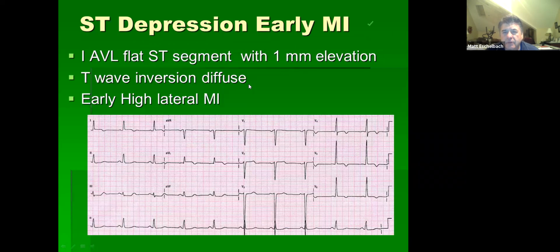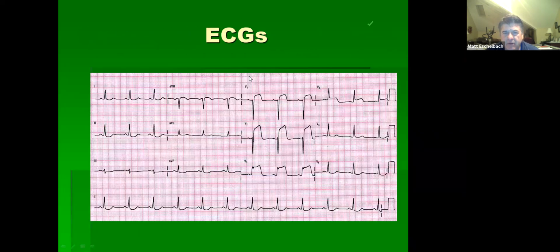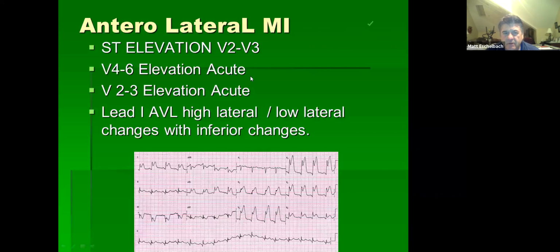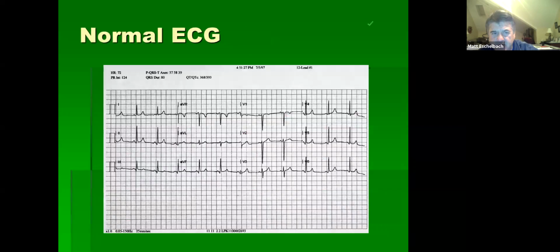Oh, where did I go? Sorry. Sorry, I'm going backwards here. There we go. Give me a second here. There's EKG, normal.